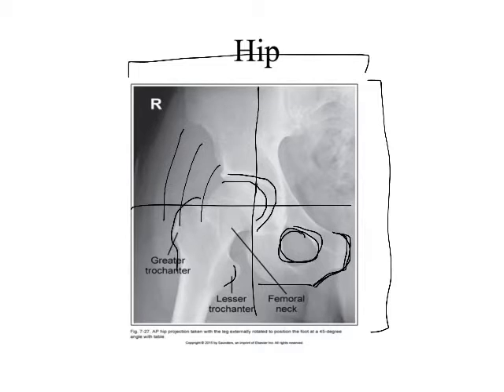So that's a helpful bony landmark for me when I'm looking at this image to describe what I'm seeing. Because it's going to let me know the femoral head and the neck of the femur have not been foreshortened, right? That could look like pathology. It could look like a fracture or something if I had the person rotated and it looked like the head of the femur was compressed into the shaft, right?